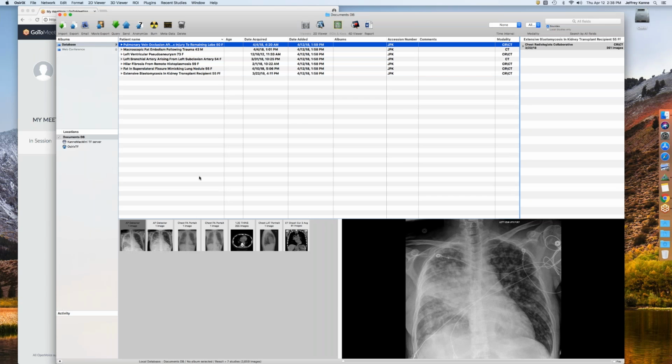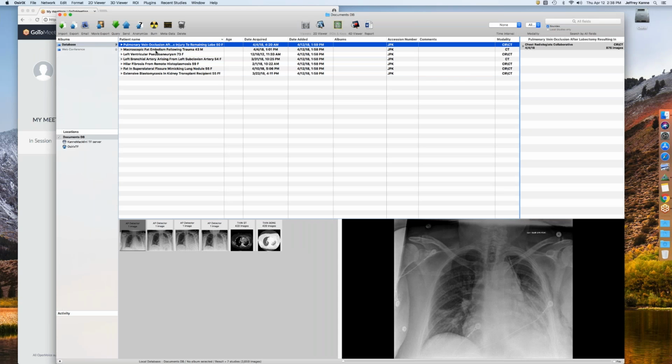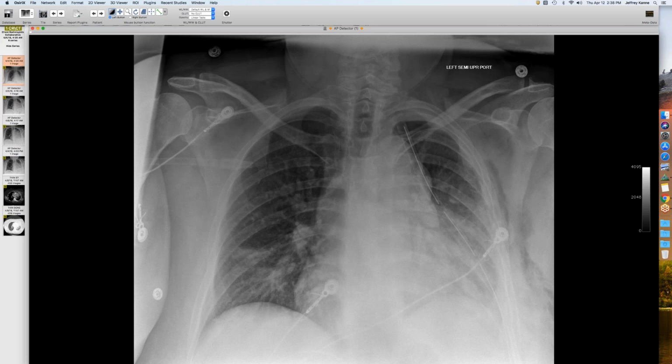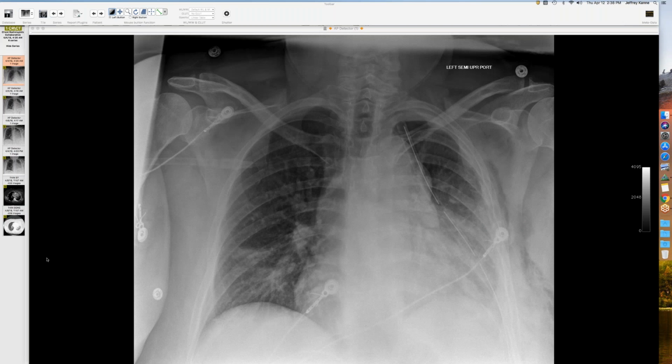Well, this was an interesting case that we don't see very often. I know, Travis, you've shown at least one of these. So this was a 50-year-old woman who had a lobectomy. I forget which lobe it was. It was one of them for a lung cancer, and immediately post-op, she was doing okay, and you can see she's got a pleural drain in, and we see a small postoperative pneumothorax, and there's opacity at the left base, but not too soon after surgery.